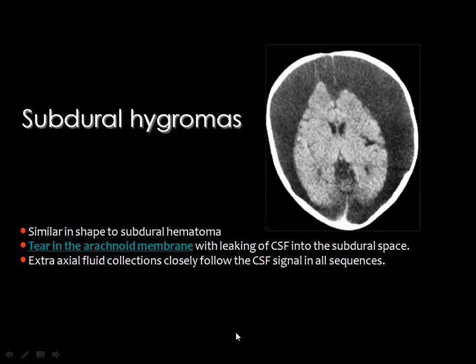of hemorrhage. Subdural hygroma will result from tear in the arachnoid membrane, and this will lead to leakage of CSF from the subarachnoid space to the subdural space. Then you got in the CT or MRI variable sized collection of CSF over the surface of the brain in the subdural space, compressing the brain parenchyma. As you can see here, this is massive bilateral subdural hygroma.